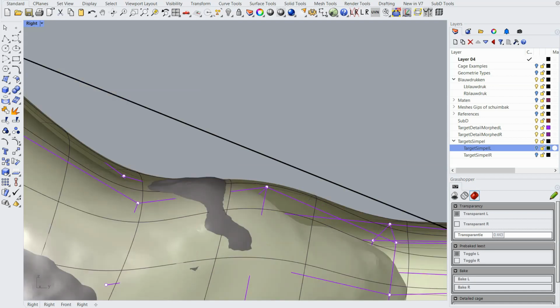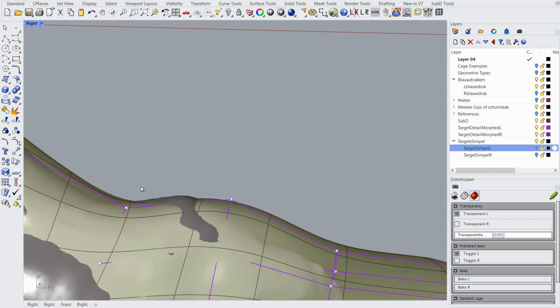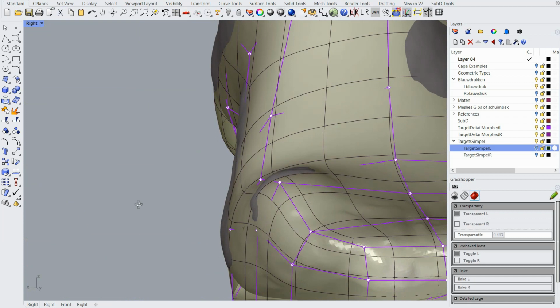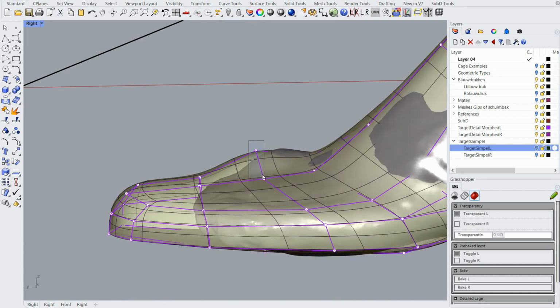This kind of decisions is what it's all about. When I make a last, I want to make a decision. Do I want to have some extra room here, or do I want it to be more narrow? And I want a cut system that fulfills these wishes. See?